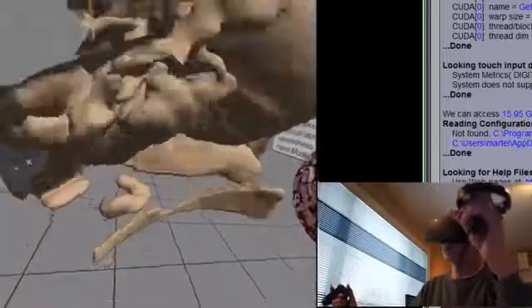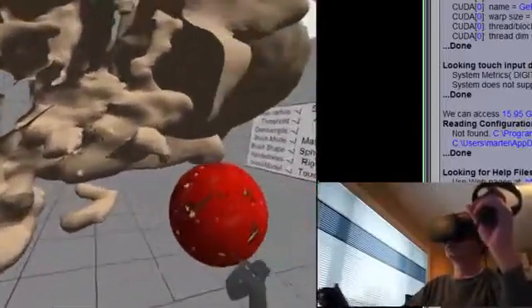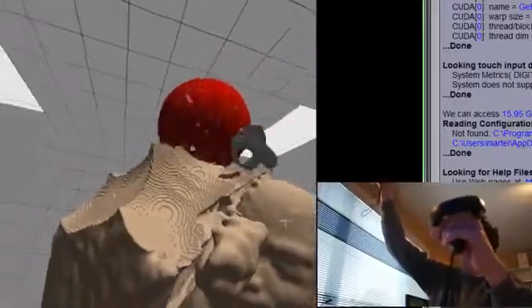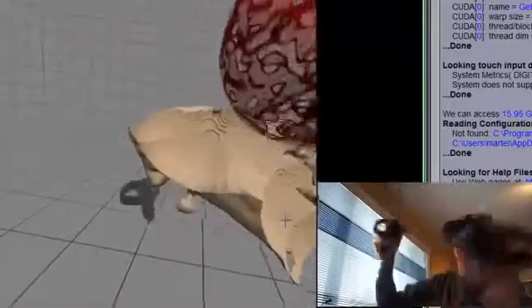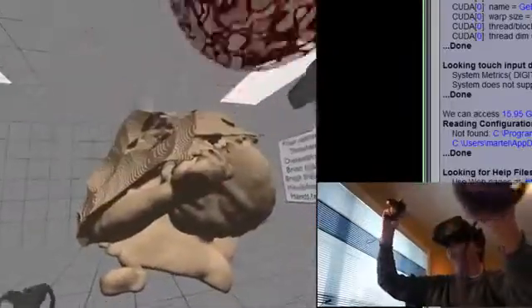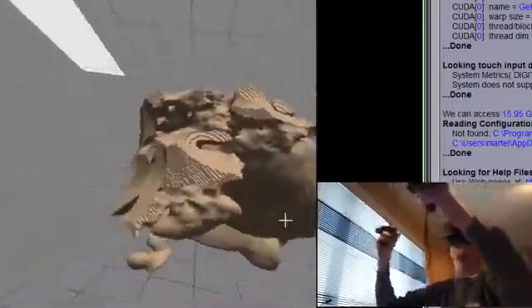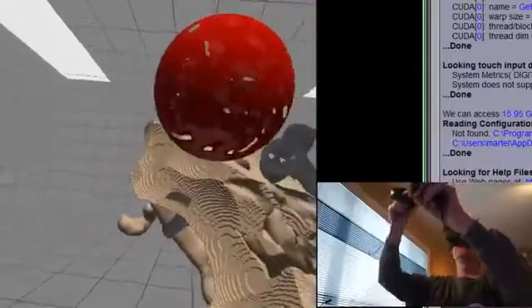So right now I'm going to edit my object. So first I'm going to remove this here in front because I don't want it. And it's gone. I'm going to clean up a little bit what I have on top here, because that's just not my baby. So I can easily come in here. If I get too close to my baby though, I'm going to use the GLI edit instead of just the mask. This is just a rough edit, and you can see by the way it looked that it is a rough edition that I'm doing right here.